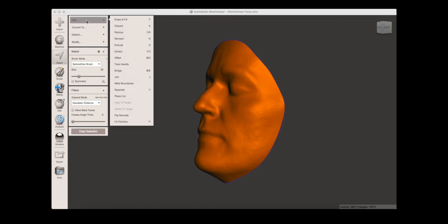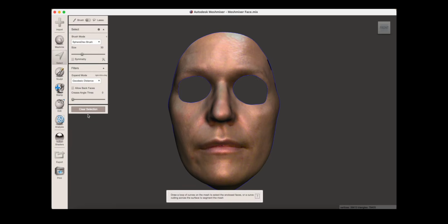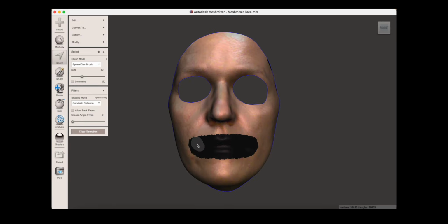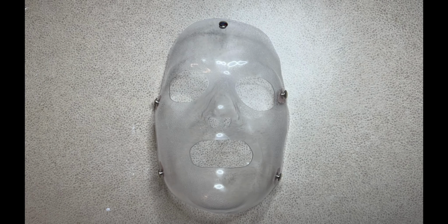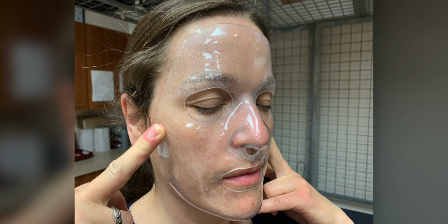This video is part 1 showing my workflow to fix up a face scan for 3D printing. I'll be using this old free software called Meshmixer, which I find is fast and useful for basic tasks. This is a case study relevant to burn therapists using orthoses to apply pressure and silicone to treat hypertrophic scarring.